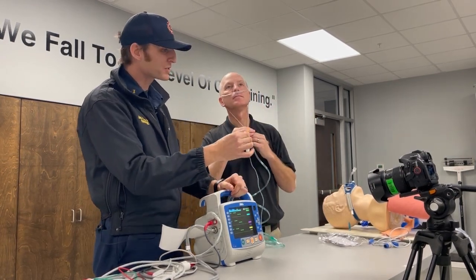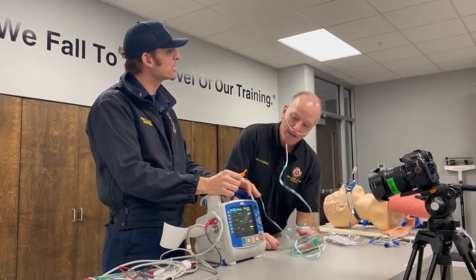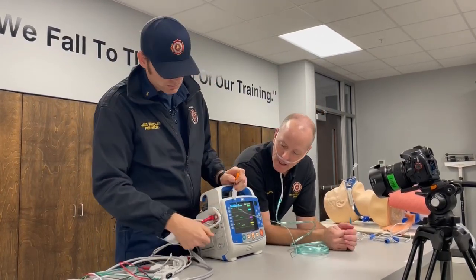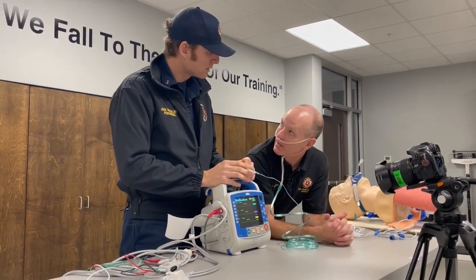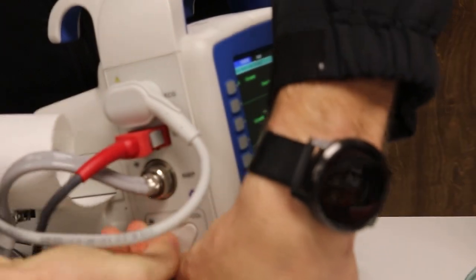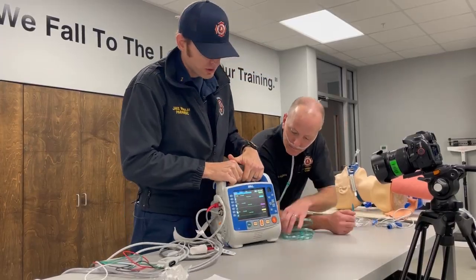So as far as actually applying this, is there anything we need to do to the actual monitor itself prior to us hooking it up? The biggest thing is remember, it's going to be in the pouch, and it's hard to get to. The nice thing about this is it's not a physio where you have to actually warm up a device or anything. There's a trap door. It's even labeled CO2 for carbon dioxide. That door will come down. Righty-tighty, lefty-loosey. Spin it.